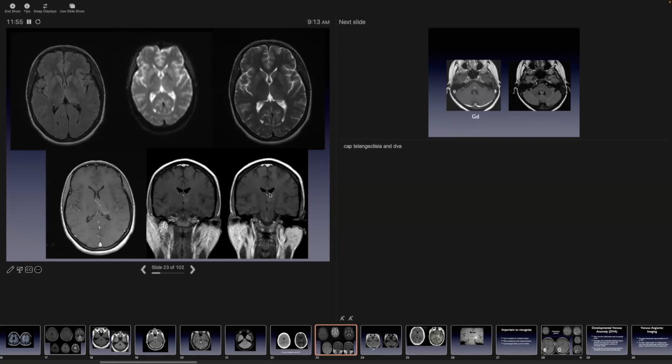And as I said, and we'll get to this a little bit, but it's always tempting when you see atypical lesions to consider the possibility of a true arteriovenous malformation. But the reason I would argue against an arteriovenous malformation in a case like this is that normally the vascular structures that you see in an AVM are high velocity flow, and they won't show homogeneous enhancement after administration of contrast, particularly when you're using a 3D acquisition like MP-RAGE.